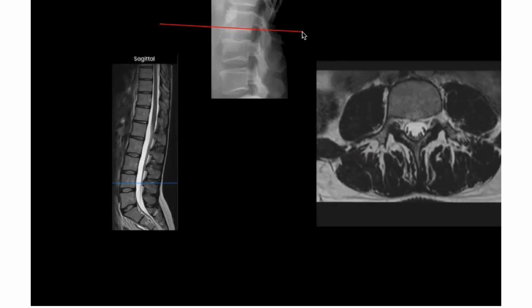Because why we are saying this? Because we can see the bone here, but as you go posteriorly, we can see the foramen here with the nerve root. Nerve root is coming out from here. Okay, and posteriorly we have the facets over here. Understood? Yes.